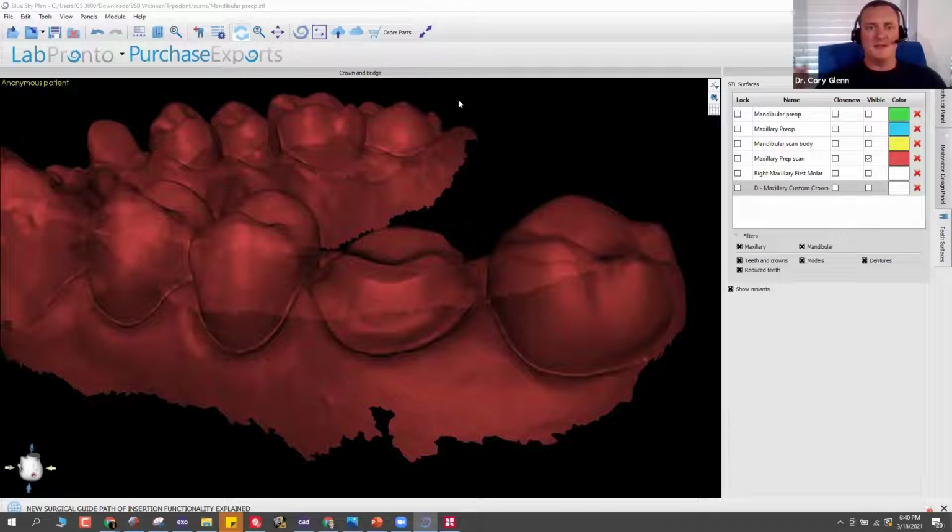Is there a minimum thickness option? There is. I didn't point that out, but when I do the bridge here in a moment, I will point that out. What code would you use for billing? Well, thankfully, I don't have to worry about that anymore because I only treat models. I'm not a wet finger dentist anymore, but I think there are codes for resin crowns, but you might check.